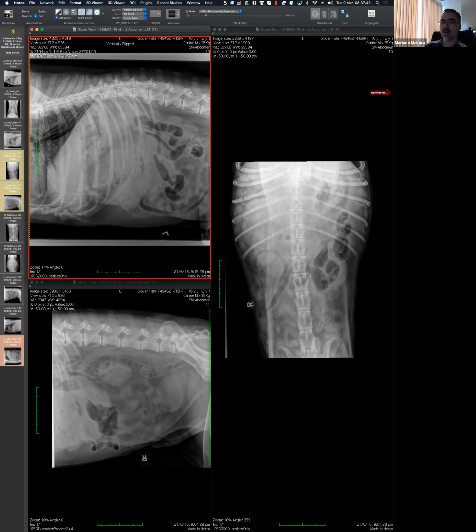Okay. Yeah. And so how are you going to put the gas in that context? The gas is in the bowel. Okay, I see. So now you're saying, I'm not sure that gas is within the mass. Maybe it's just superimposed. And then there's just a hemangiosarcoma in the spleen, which is also soft tissue. I think I would listen to that option. And I think it's very hard to prove you wrong. I personally believe that there is some of that gas that is within the mass. And therefore, I would probably also consider something like an abscess or a torsion.